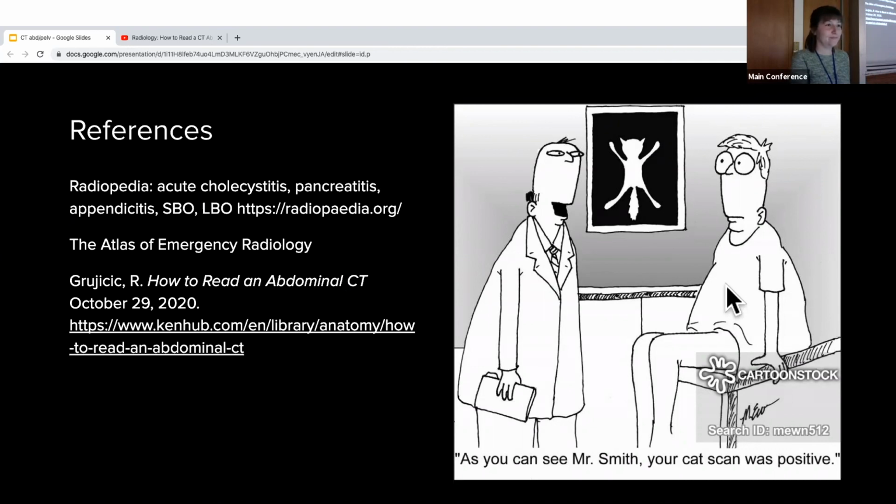I think one thing that kind of helped me is the 3-6-9 rule. So kind of along your 3 for small bowel, 6 for large bowel and appendix, and then 9 for cecum. It's like an easy 3-6-9 rule.